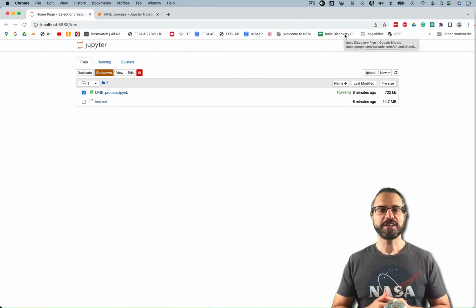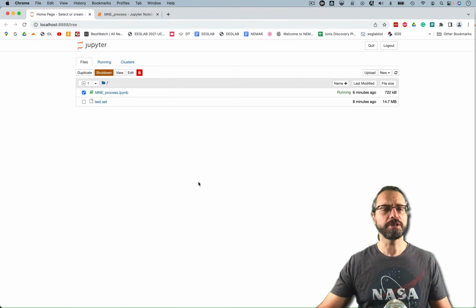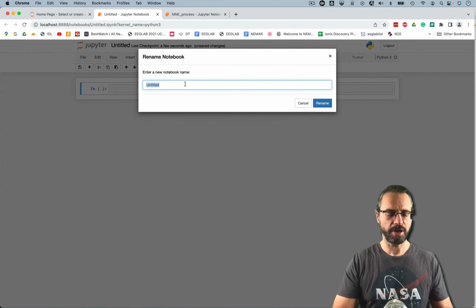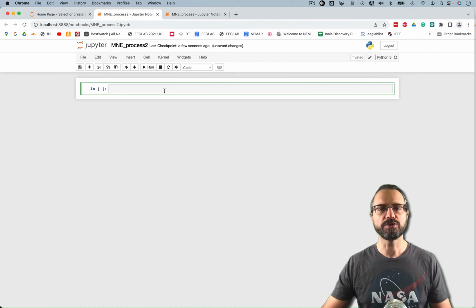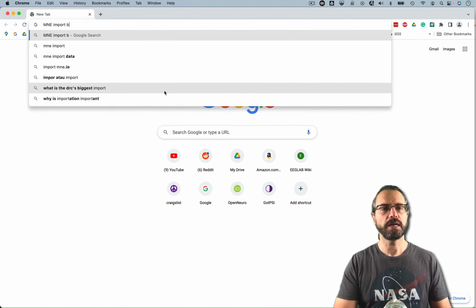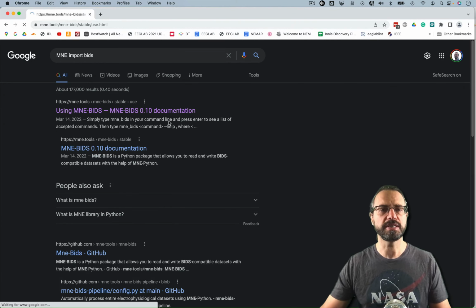So now let's get started with MNE. Here I'm going to use Jupyter Notebook. I'm going to create a new Python 3 notebook, and call it MNE process 2. For this, I'm using mostly the MNE documentation. First, I'm going to import a BIDS dataset, because the goal is to compare pipelines across BIDS datasets.